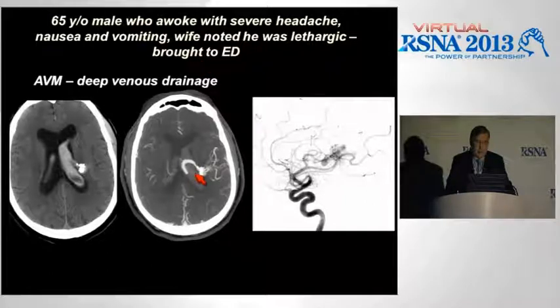And we can appreciate there's this large calcified area here along the lateral margin of the ventricular system, blood within the lateral ventricle, these hypertrophied, enlarged branches from the angular artery, and then this calcified nidus.